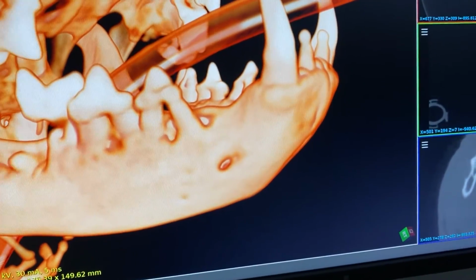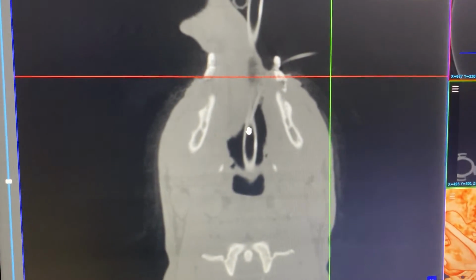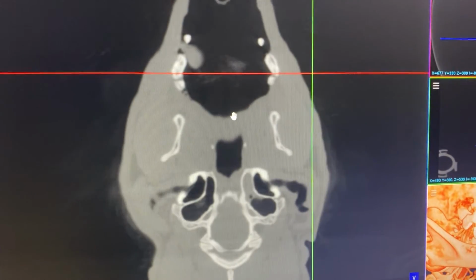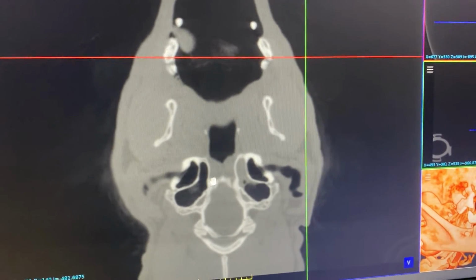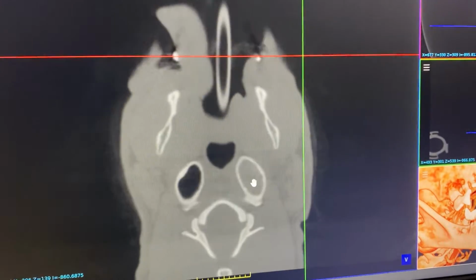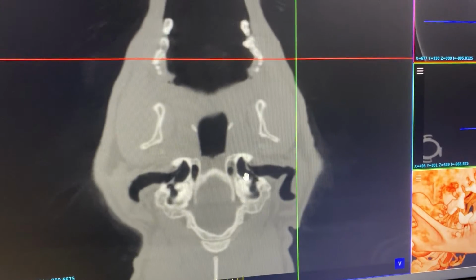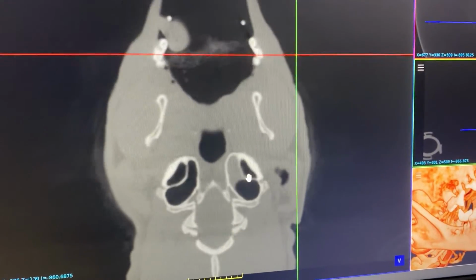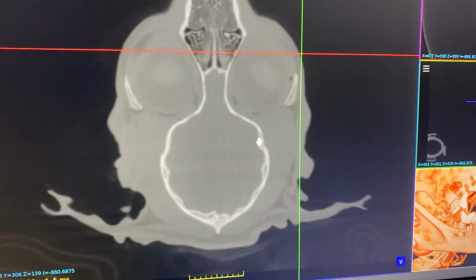For an additional bonus image, we do the full CT of the full head, and then you also can see now, here are the ear canals. You can notice that there's changes. So these are actually the bulla. You have one on each side. And the left bulla has more opacity, increased density, so supporting a potential inner ear infection, which the patient was not showing any signs of, but we found that incidentally on the CAT scan.